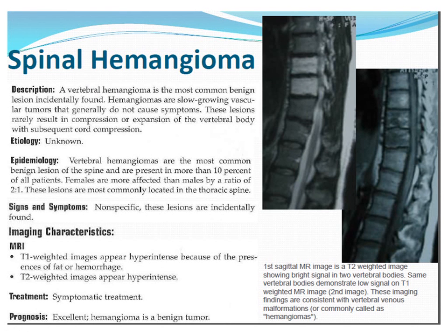The key to this lesion is that with a fat suppressed image or a STIR image, you're going to see that the bright signal will drop out. Fat suppressed T2 or STIR image, you'll see that this fat signal will suppress out, and that gives you an idea that it's a hemangioma. Some radiologists don't mention them unless they're very large, or unless they suspect that it could be causing symptoms.